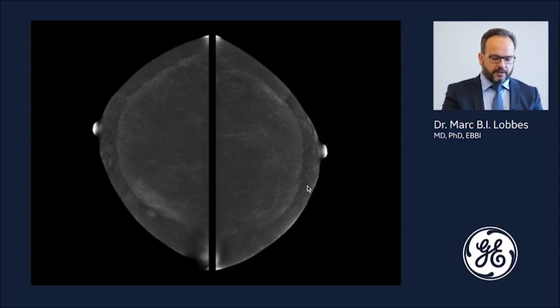And again, these are the craniocaudal views of both breasts. And if you look carefully in the medial part of the right breast, you see a small, quite well-defined oval mass enhancing on both images, but it's best appreciated on the craniocaudal views. We targeted it with ultrasound, we found a lesion, we biopsied it at the correct position, and it turned out to be a fibroadenoma.